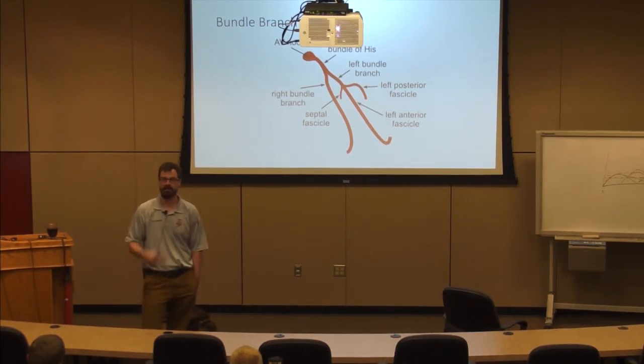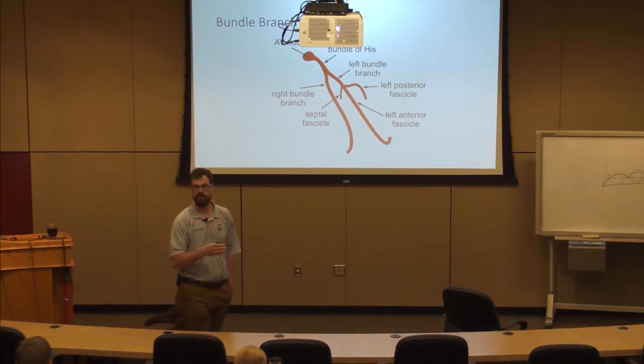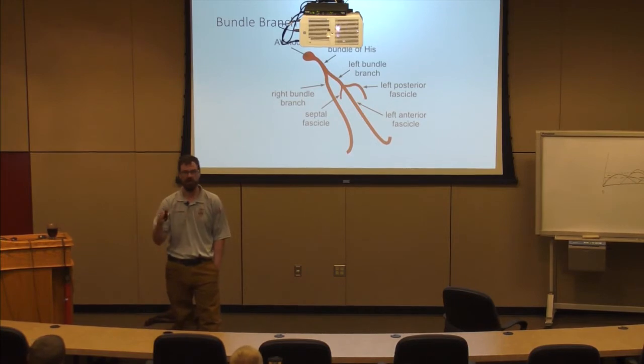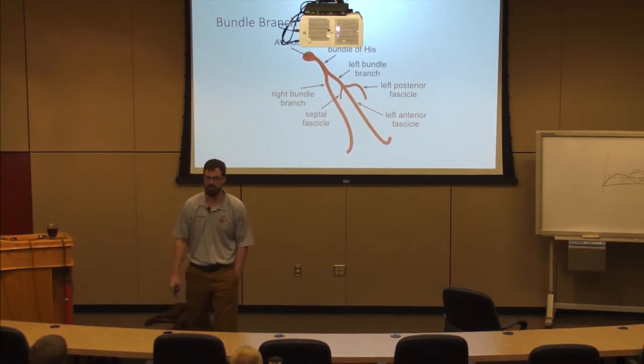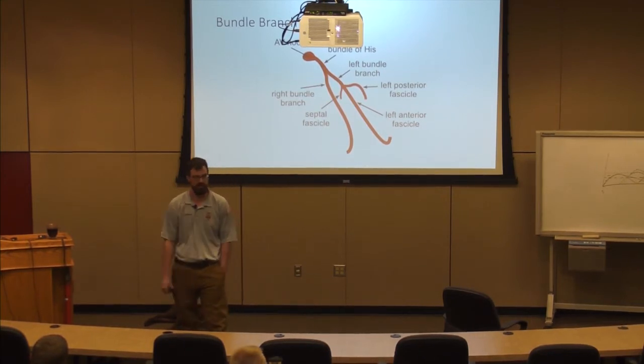I've got a diseased pathway, the result is slow depolarization of one ventricle, and consequently a wide QRS. When I deal with sodium channel disorders, or tricyclics specifically, I get a bizarre wide QRS complex. Or hyperkalemia, I end up with a wide complex rhythm when it's really bad.